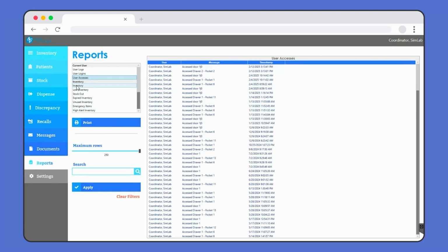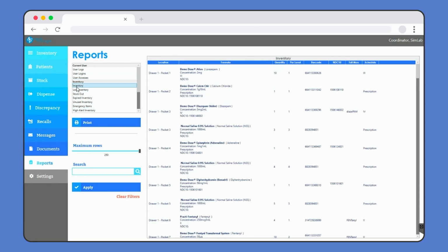This section is more applicable for our pharmacy tech student learners, but it's available to all users. And from the inventory perspective, when you highlight the tab here, a subsequent page presents itself of all the medications that are stocked within the medication cart or cabinet device, as per the customer preference.